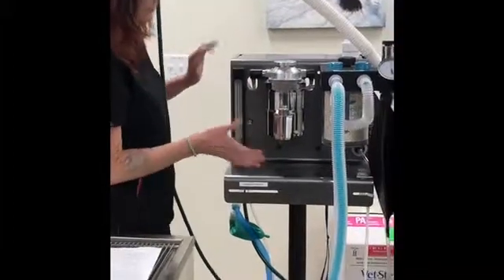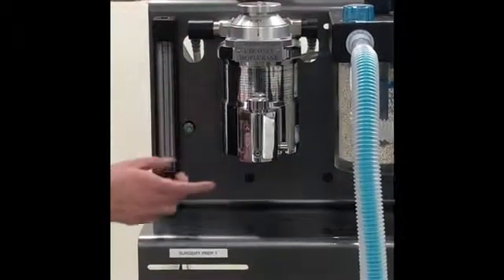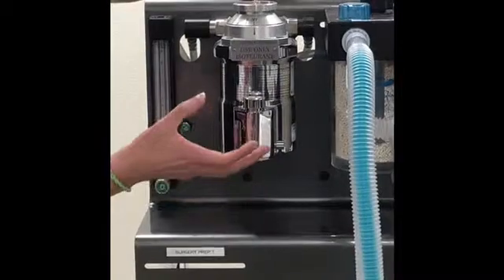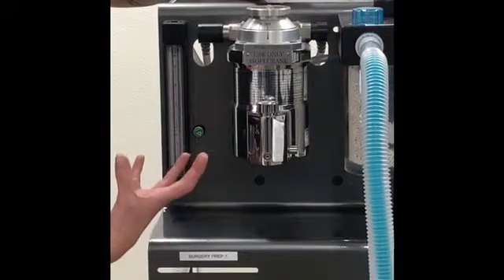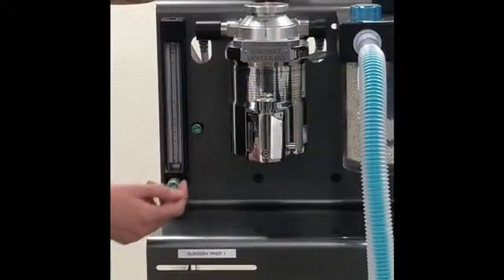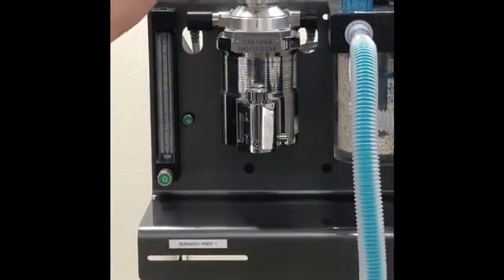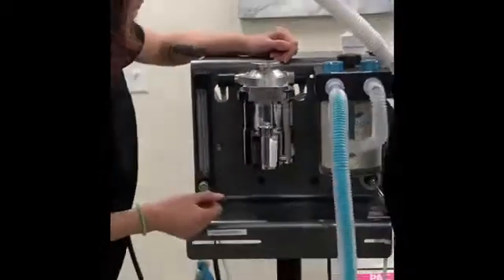So next we have our vaporizing unit. This unit has a precision vaporizer. The oxygen actually flows into the canister along with where our liquid anesthetic is placed in. This unit evaporates that liquid into a gas, and it mixes with the flowing oxygen from the flow meter, and it makes our anesthetic mixture that our patient receives. This is called a precision unit because with this knob on top, we're able to control how much of that mixture our patient is getting at one time.